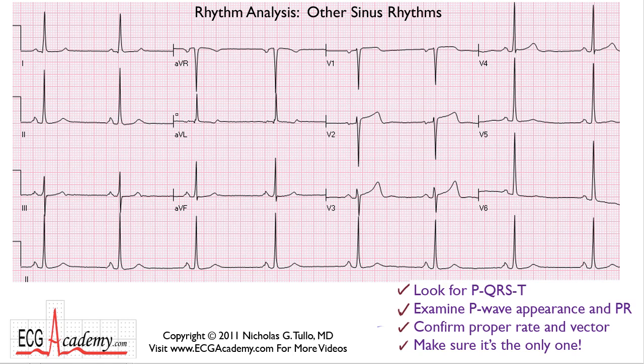So we'll look at this cardiogram right here. If you look at lead 2, you see a very generous P wave here, and a QRS complex that looks pretty large, and we'll get into how to diagnose abnormally high voltage in the 12-lead course. The T wave looks appropriate. The QT interval seems reasonable. It's less than 1/2 the R to R interval.